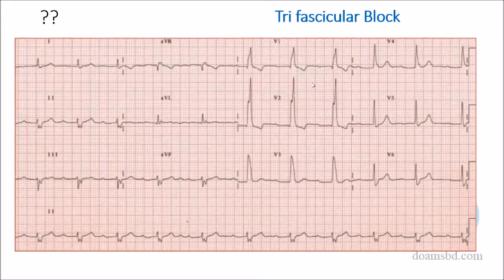Okay, Dr. Karishma, can you hear? So now let us see. If we see the long lead 2, is there any prolonged PR? Ankit was talented before to identify something else. What is the PR? Ankit, Dr. Abdullah, is the PR normal? Prolonged, sir. Prolonged PR. So prolonged means a component we found from the AV bundle, that means the common bundle, bundle of His.